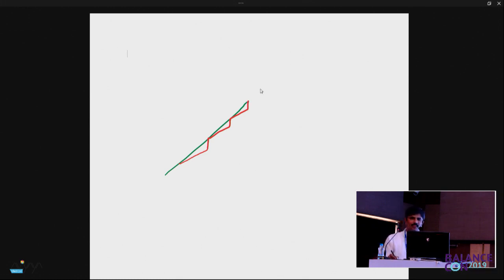This is called, it is going off. The target is going off, the eye is trying to catch up with the target. So what will this be called? Catch up saccades. Fine.